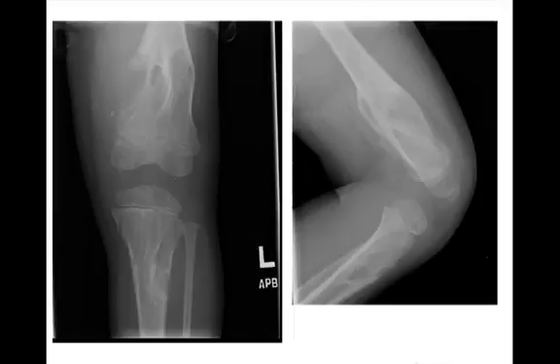Okay, so two views of the knee in a child. So this looks pretty weird. You can certainly see there's abnormalities to the distal femur and proximal tibia. You have these lytic tracts which are extending from the physis and growing into the diaphysis. This one's scalloped out the bone. There's some calcification in these soft tissues adjacent here. This is just the other view showing it.